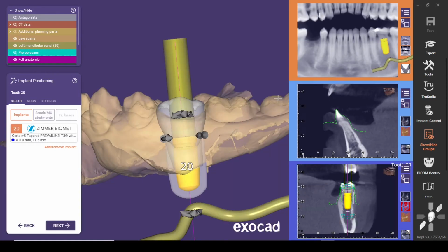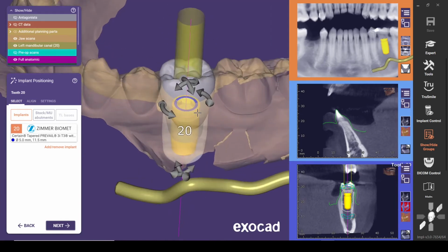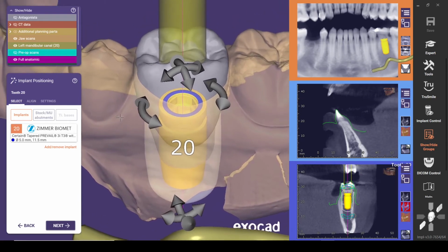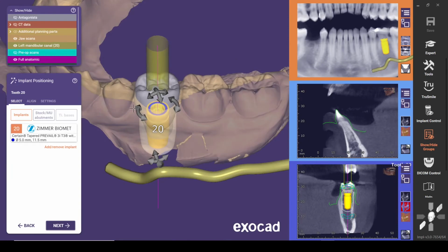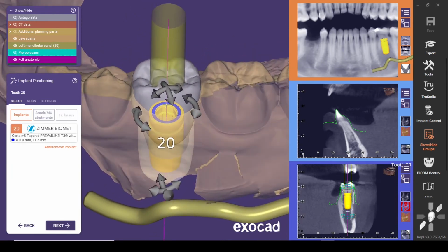It's always these window keys. So the other thing we want to look at is the hex position. With this implant brand, and you're gonna know your implant brand and its details, the surgical kit, the drill fixture mount that attaches to the implant is based on the flat part of the hex.